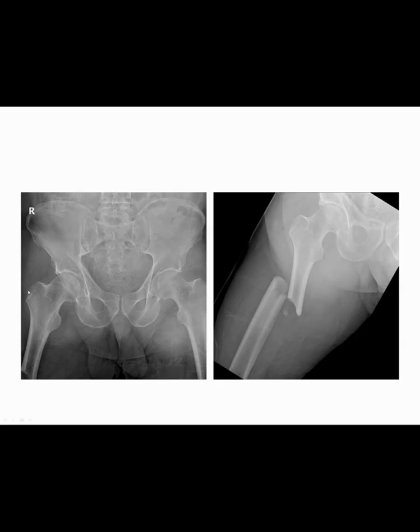This is an example of some of the radiographic images provided to you in the patient's imaging file. And we'll talk more about our finding here, but we can appreciate that there is an obliquely oriented fracture through the proximal femur. And when assessing femur radiographs, it can be helpful to provide an approach to both pelvis and knee radiographs in order to provide a complete assessment.